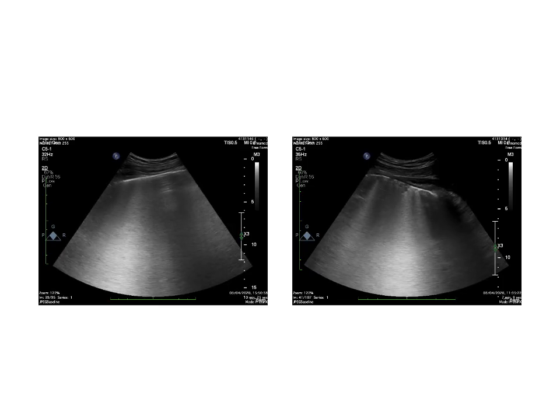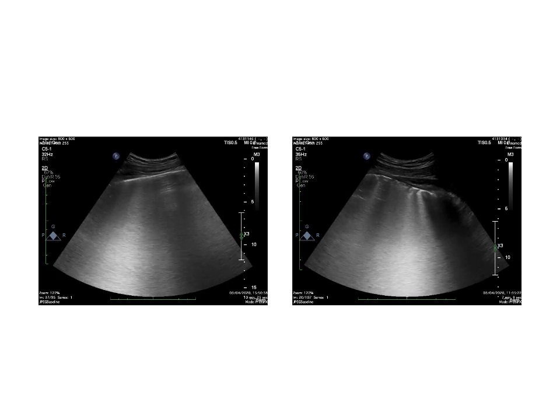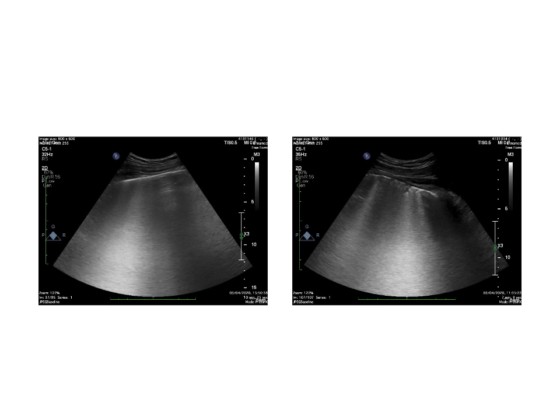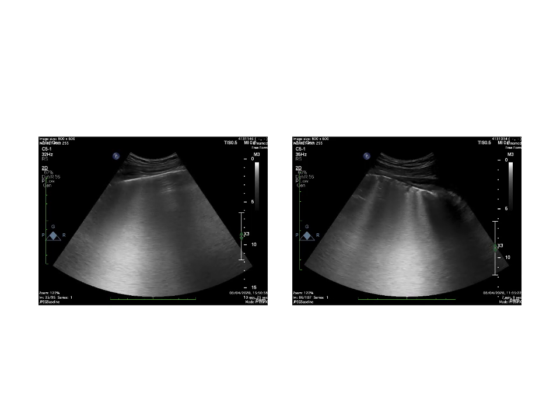And then we come to this very bright and shiny pattern of B lines, which are very often seen in COVID-19. So this is what we usually or mostly see in patients with COVID, patchy areas of B lines. You see this very white, shiny pattern. So the sector is divided into an area which is black, which is the normal aeration and the preserved spared area of A lines, and there's very white.